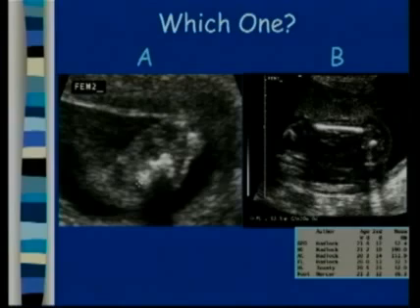Okay, here's another case. Which femur would you rather have, A or B?